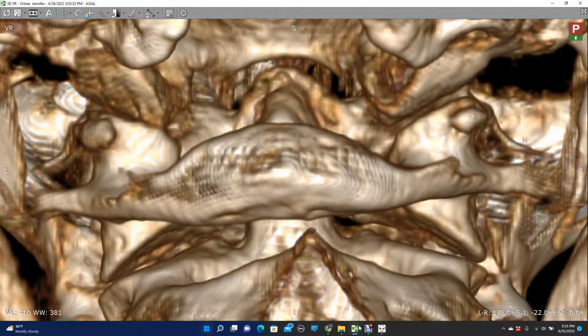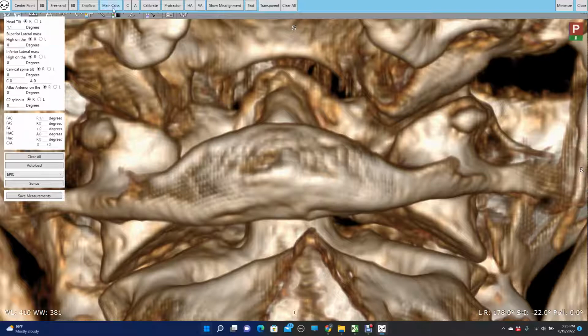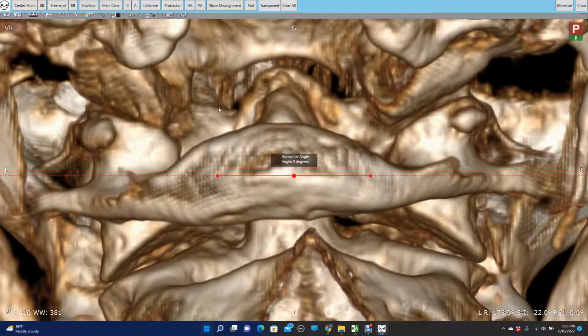And we will once again activate the toolkit. And the horizontal angle tool I will place just above and lateral to the joints I wish to measure. And then I will use my arrow keys to start to drop it down on top of those joints. And since it's dropping and hitting the right side first, I will use the other arrow keys to add more tilt and just try to drop it on both of those at the exact same click.